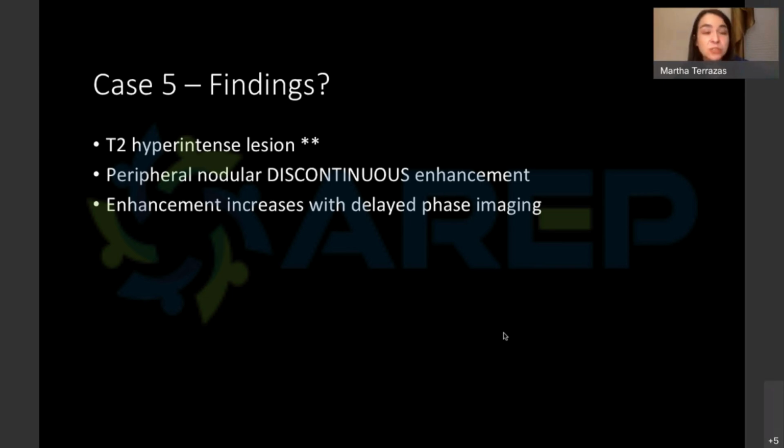Could it be an atypical sclerosing hemangioma? Absolutely. But those are one of those lesions that are a diagnosis of exclusion. Either we get a PET CT to prove that it's not avid, or they biopsy it, or we just follow it for a long time.